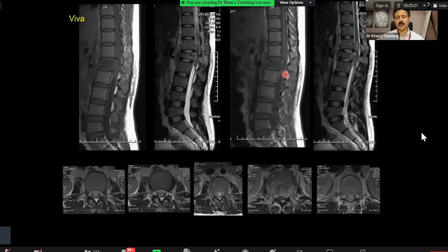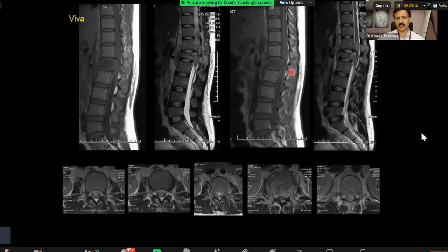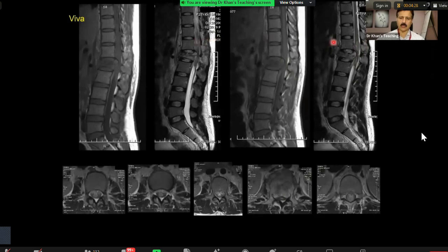Excellent. So please remember, epidural hematomas can be spontaneous also in the cord, but having said that, in trauma, just wanted to show you an epidural hematoma. Here, clinically speaking, the most important points are that because of this compression, there is retropulsion of the bony fragments into the spinal canal. This is what you have to report, and which is causing cord compression. And then there is high signal within the cord, and there is a low signal on T2 and high signal on T1 means cord contusion. And this is a hemorrhagic contusion. Hemorrhagic contusion in a trauma case is taken as a sign of bad prognosis.